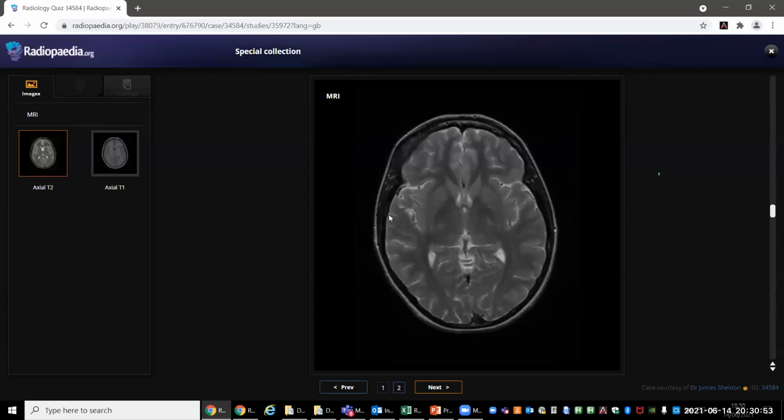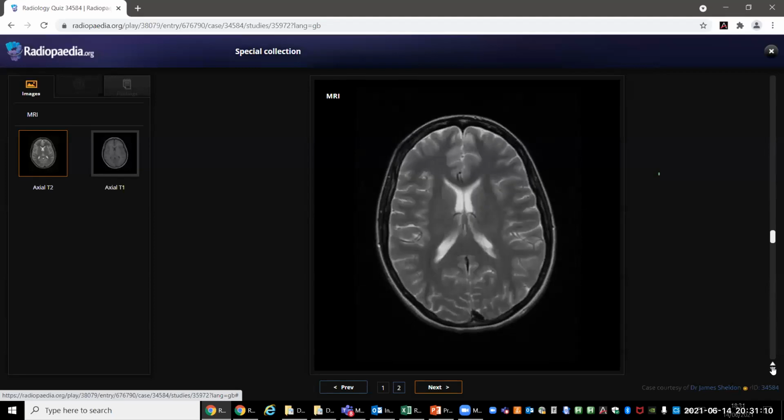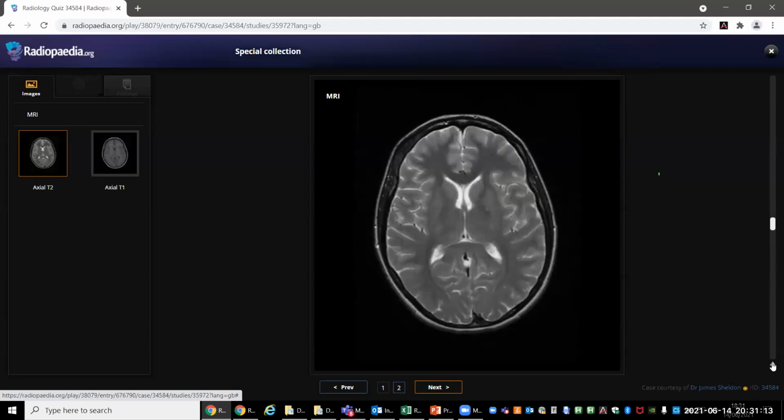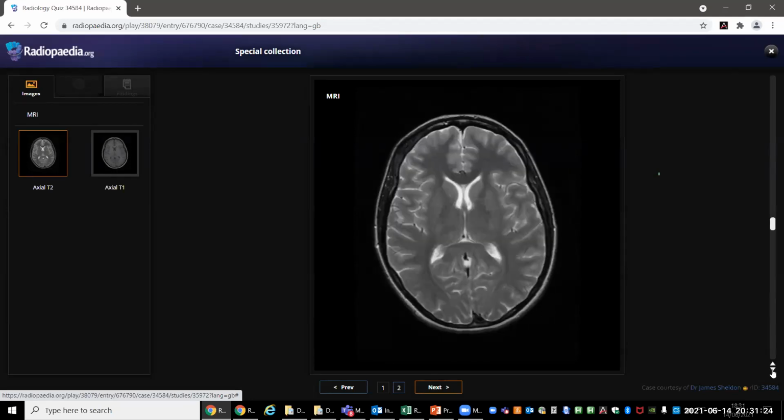In a female patient with bone expansion, I'll be suspicious about Paget's disease first. She's 30 years old. So it can be an intraosseous lesion like meningioma. Does the patient have any other history, like any blood dyscrasias? Just headache. So it can be an intraosseous lesion. To look at the bones, I'll suggest a CT scan to further narrow my differential.